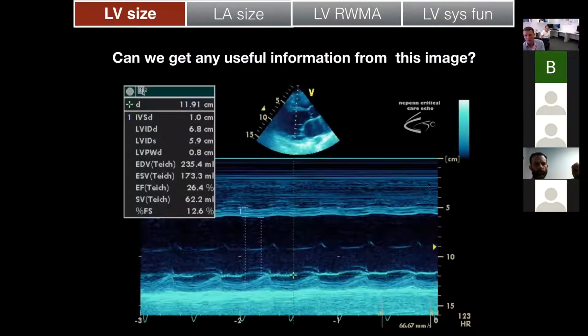But this picture is also off axis based on that rationale, right? So do we completely ignore this? So we got numbers here of 68. So you're saying we don't believe that, and I'll agree with that. But is the image completely useless? Is there any other information you can glean from it though? Well, probably you can measure the wall thickness, and that could give us an idea.